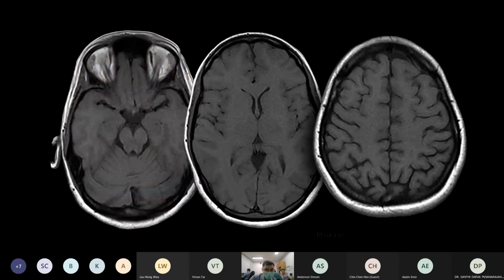And these are the different cuts of a normal MRI brain. You can see this is the Sylvian cut, this is the ganglionic view at the basal ganglia, and this is the superior interparietal cut. If you want to light up with gadolinium, a lot of things are going to appear bright. So what we usually do, under the MRI, is the radiographer will suppress the fat tissue, which means in our orbit here, there's muscle and there's fat in the extraocular muscle. If you suppress the fat, the bright will become dark. And you add on the contrast, which is the gadolinium, so it will become like this.